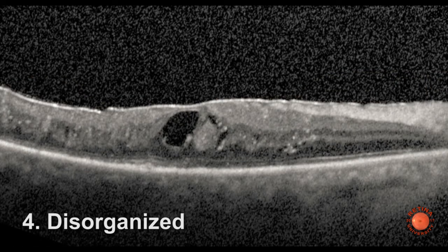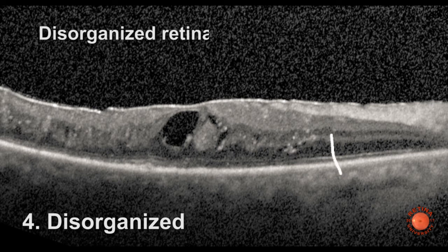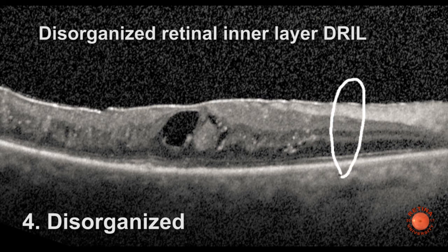Finally, disorganization of the retinal inner layers is an entity that's sometimes seen in diabetics, such as this macula, where you can see instead of the nice linear bright and dark lines you would see on an OCT scan through a normal eye, the inner retina is disorganized.